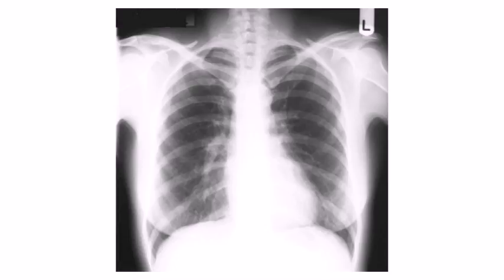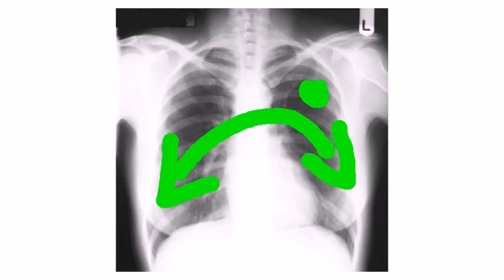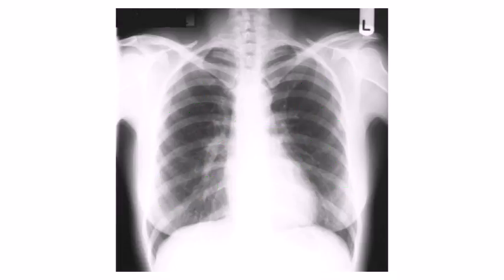Once you've crisscrossed both sides, then you compare both sides. If you find something here that's normal, you want to make sure it's not here as well, because chances are that something pathological won't be equal and symmetrical on both sides. So that's basically the principles of radiology by Felson.